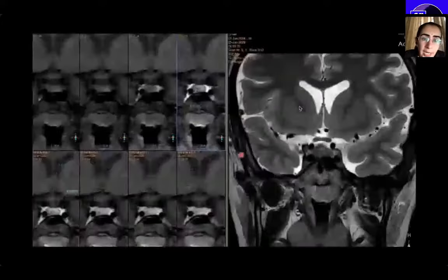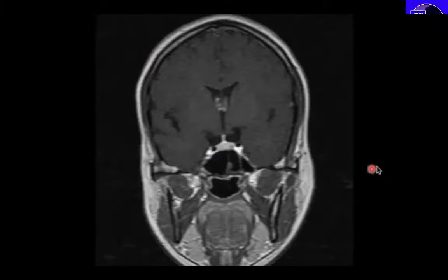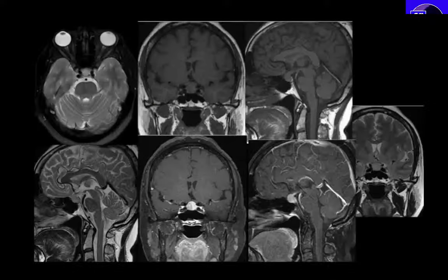So this same microadenoma, again I have shown on the dynamic sequence that this enhancement is seen, and I have marked out the size also. It's around 4 millimeters in diameter. And it is hardly seen on the T2 weighted sequence. Here we have another patient, a 27-year-old female with a tiny microadenoma on the left side of the adenohypophysis. Then we have a 51-year-old lady with a headache.